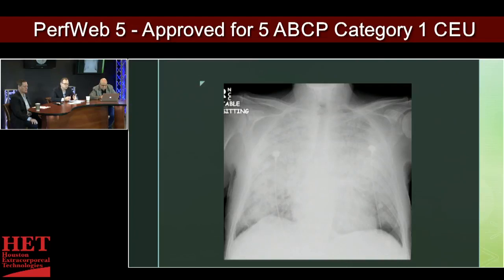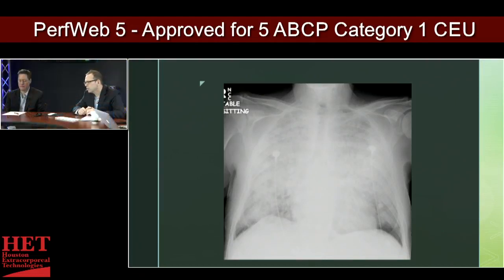And so then you just start to describe what you see to better refine your list of diagnoses. And so this is a fluffy white pattern involving the upper and the lower and the middle lobes of all the lungs. I don't see big fluid collections down along the diaphragm on the sides here, which you would often see. And so this would be a picture consistent with an ARDS, okay?